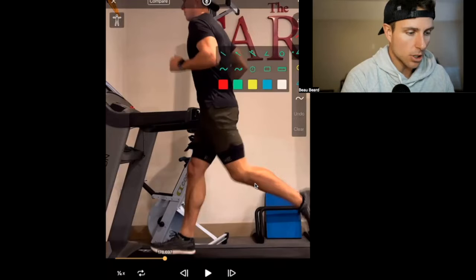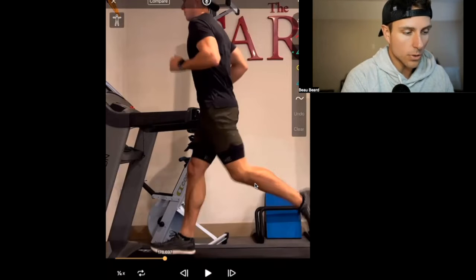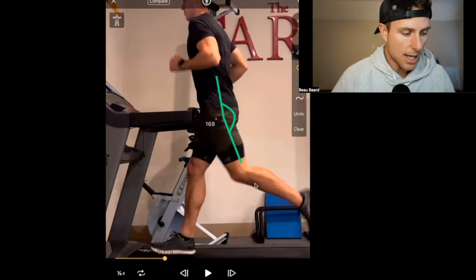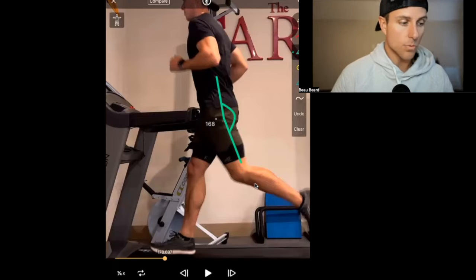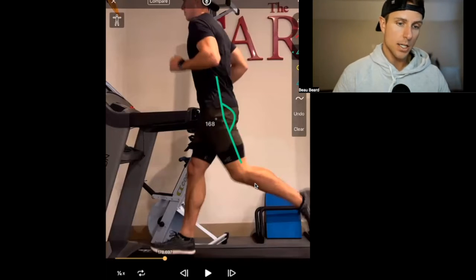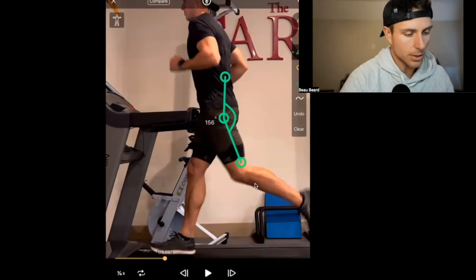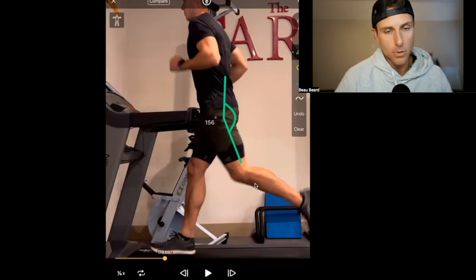So again, if I draw an angle off of my torso, not perpendicular, because you can see that my angle is forward in space. I draw that to my hip, draw that down my leg. And it's hard to gauge exactly where that's at, but you can see that's not that much relative hip extension to my torso lean. So it's not that it's neutral, but you'd be like, man, off perpendicular. So if I move this to perpendicular, like, oh, it's not bad. That's not where my torso is in relation.